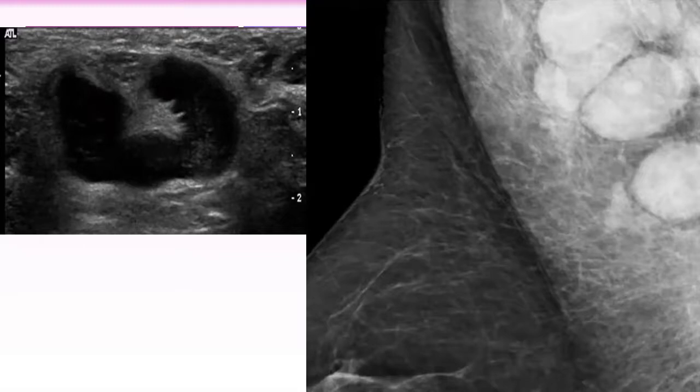What about the adjacent tissue? It looks normal with only the lower one showing surrounding perinodal edema. Yes, perinodal edema. So definitely these are pathological lymph nodes and even suspicious on mammography. Suspicious lymph nodes. Okay.